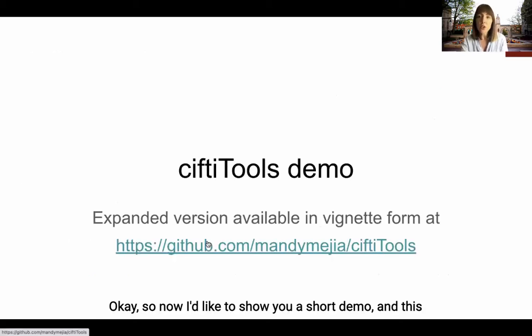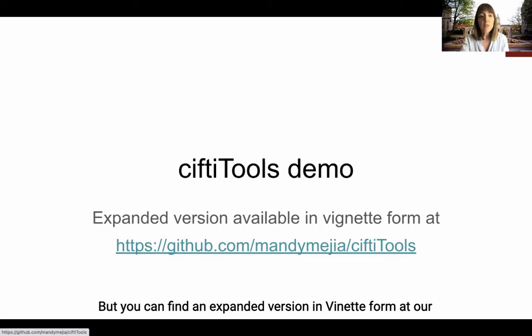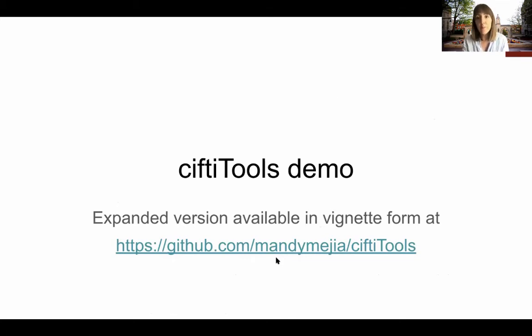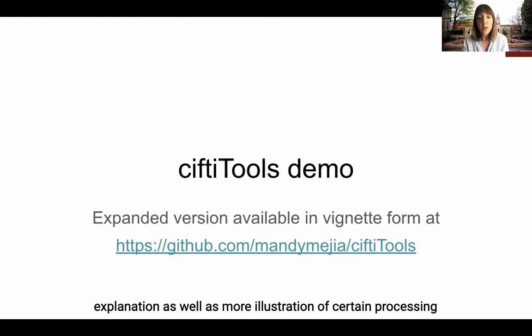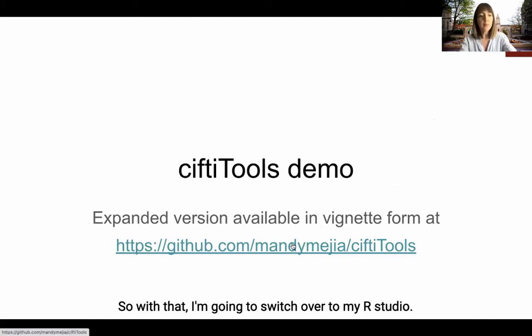Okay, so now I'd like to show you a short demo, and this demo will focus primarily on reading and writing and visualization, but you can find an expanded version in vignette form at our GitHub page for this package, and that will include more explanation as well as more illustration of certain processing and manipulation functions as well. So with that, I'm going to switch over to my RStudio.